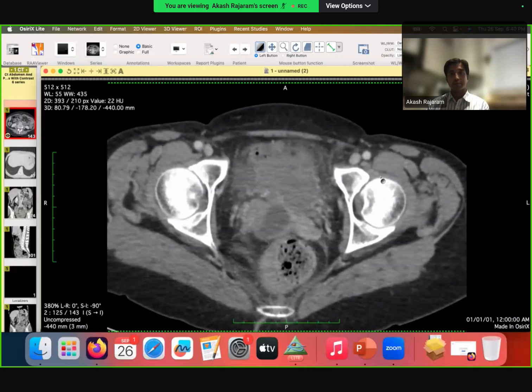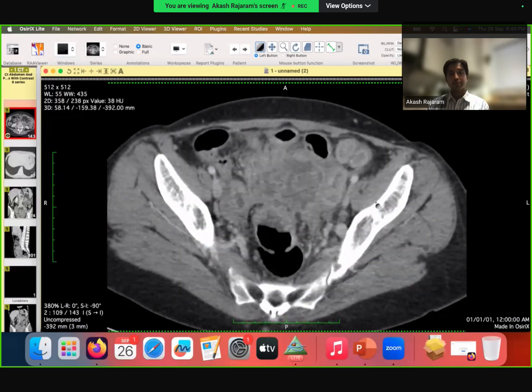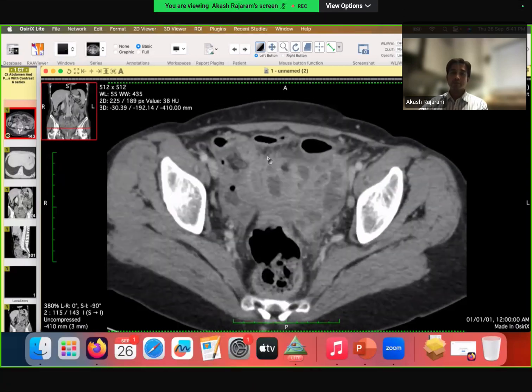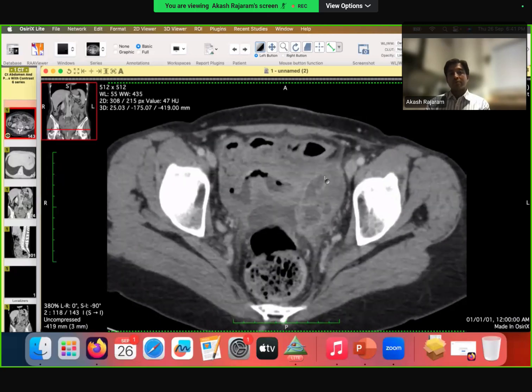So, disease progression makes me concerned about presence of a mass that has progressed further and maybe invaded the adjacent small bowel and the urinary bladder wall. Other possibility is complicated diverticulitis, but I think it should be improving with antibiotics. I can't see any intravesical air, so I don't think it's a fistula. It's maybe infiltration of the wall by the tumor instead of a fistula.